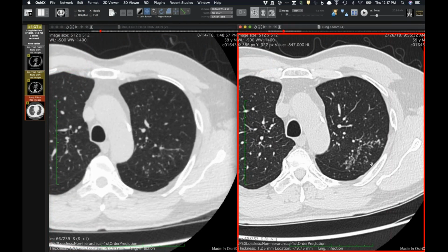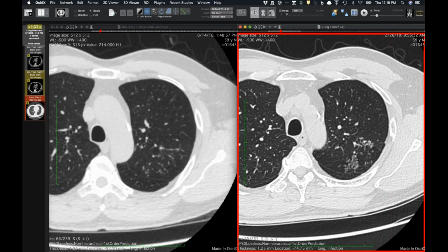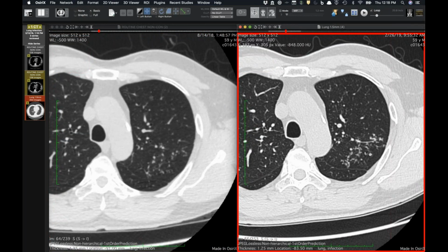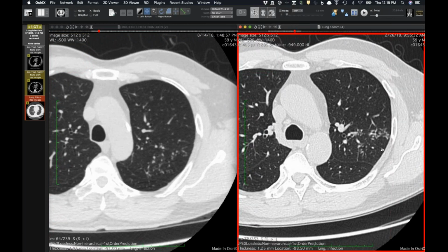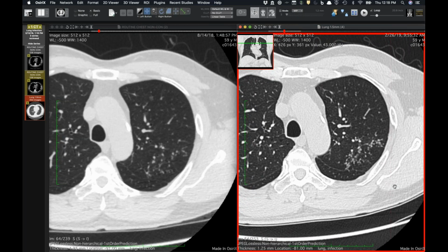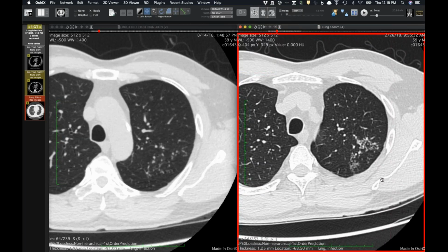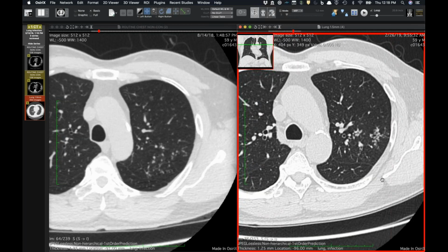One question I have for you guys, I think it's always important to not forget about TB in particular in patients that are immunosuppressed. It's kind of hard, and I like to show this one to my residents. There's often struggle between differentiating, is this all centrilobular, is some of it perilymphatic, or is it a combination of both? Because there are maybe a couple nodules that dot the fissures and the centrilobular and the pleural surfaces. I would argue it doesn't really matter, certainly since TB can do both. But I don't know if anyone has any comments.